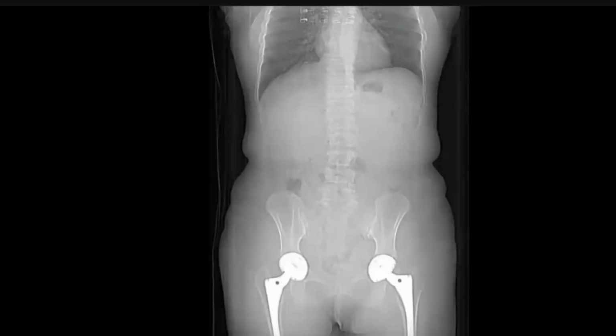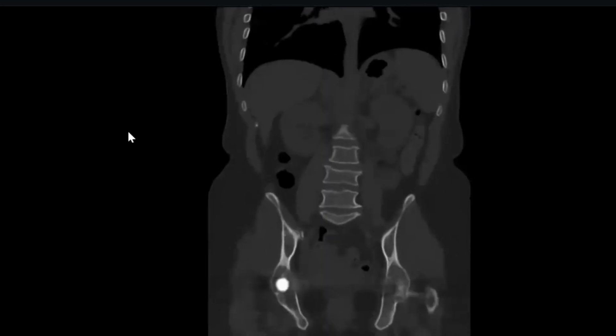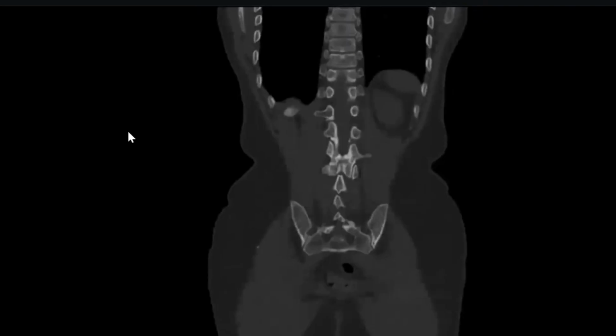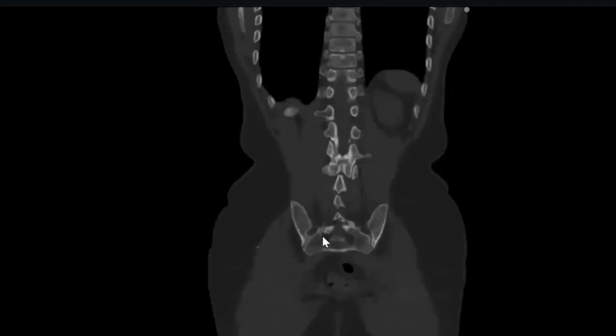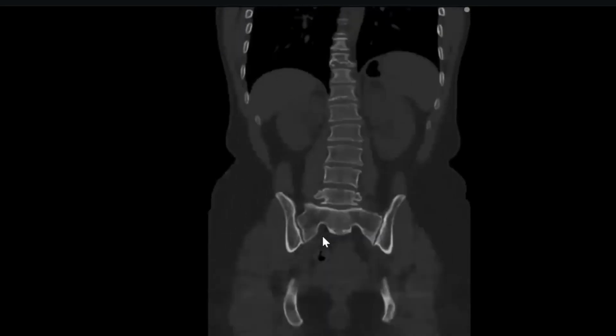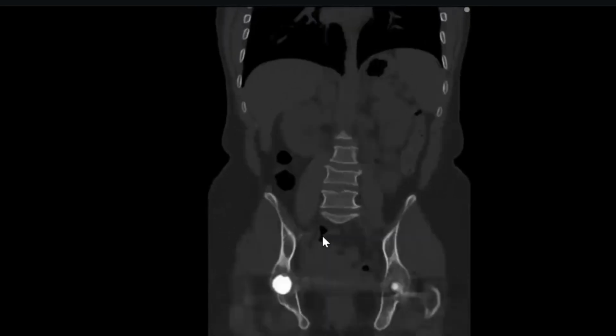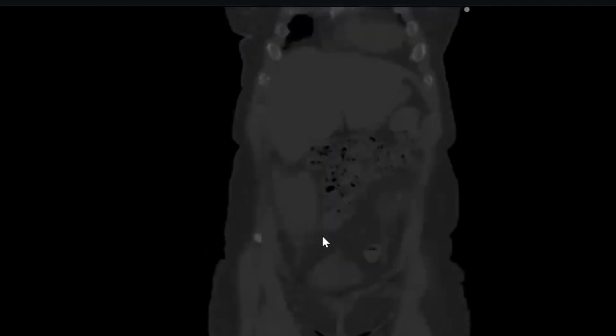What is the other criteria? Like other bone infarction. So the bone must be overall sclerosed. See here, the bone sclerosis. Overall normal, except the spine. See here, my colleague, the spleen is normal. No gallbladder stones, no H-shaped vertebrae.